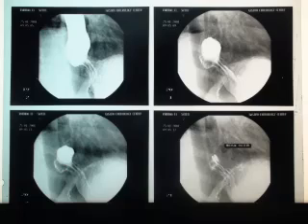Now, this is another example of the same disease and same problem. Here we can see the esophagus and the stomach. Here, this is a part of the fundus of the stomach. You can see here these folds are called the gastric rugae, and this part of the gastric rugae is present inside the chest. So, this is a sliding hiatus hernia or type 1 hiatus hernia.